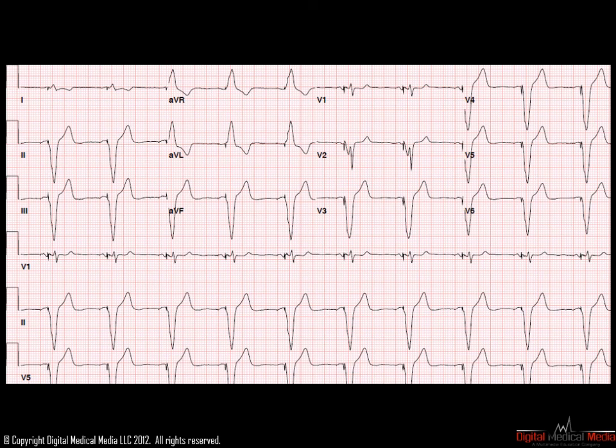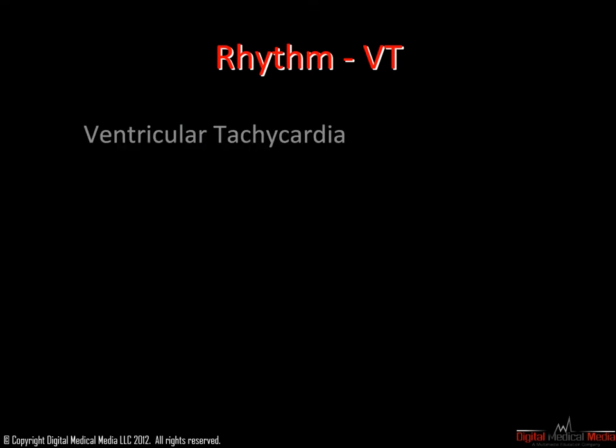If we move our eyes then to the QRS, we see that a similar electronic impulse is present right before the wide QRS, which is present following the impulse. This is a typical dual chamber pacemaker. The rhythm should be correctly interpreted as dual chamber pacing. The final rhythm which we may encounter on a 12-lead ECG is that of ventricular tachycardia.